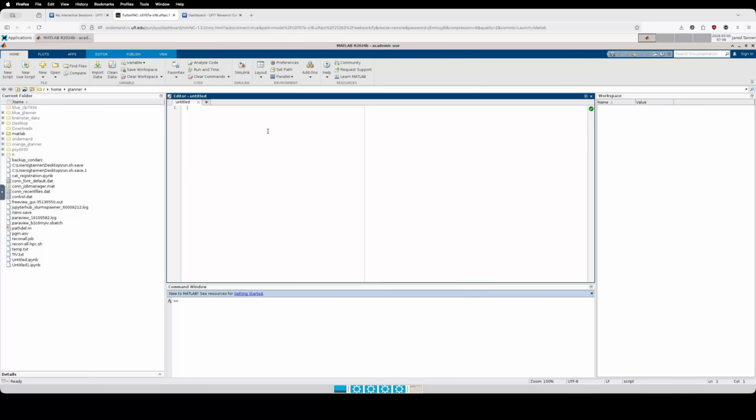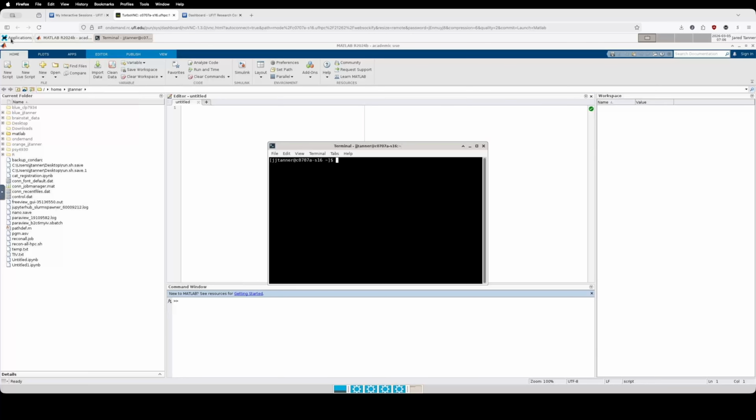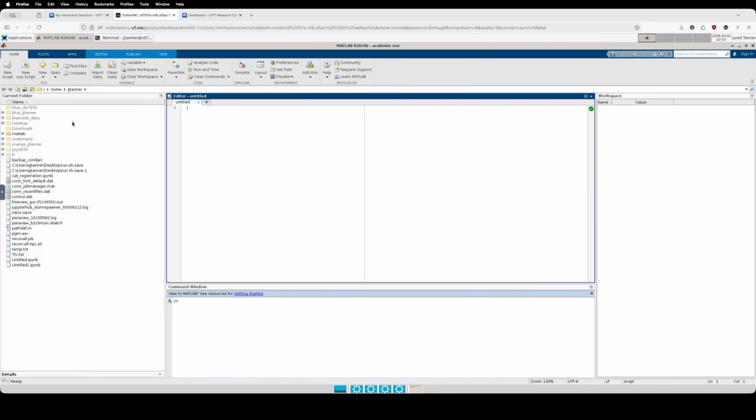And the first thing we want to do is make sure SPM is available. And so to go there, I will open the terminal. So Applications, XFCE terminal. And then I will cd Blue Sci 4930. And that will force a connection to our class drive. And then over in the MATLAB window, we can now set the path.